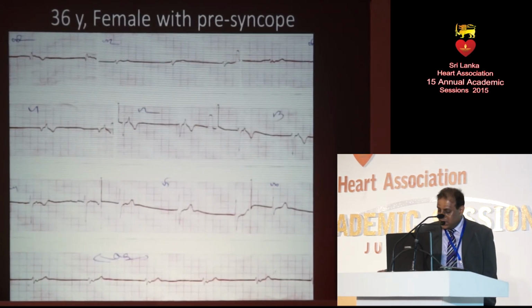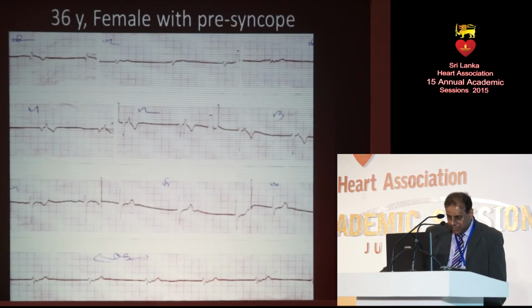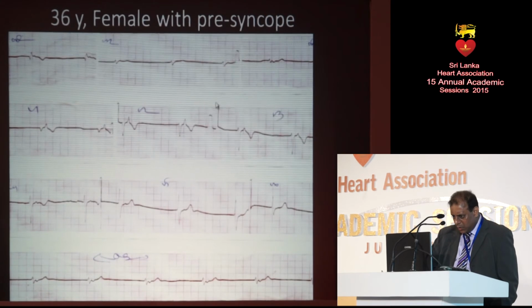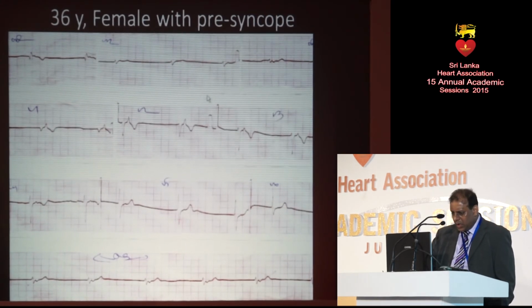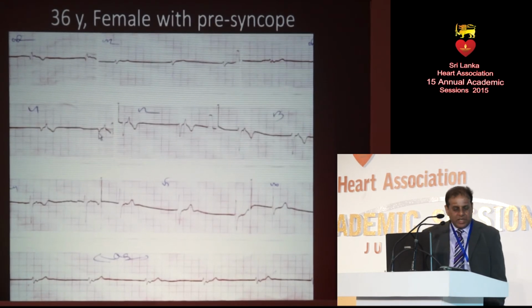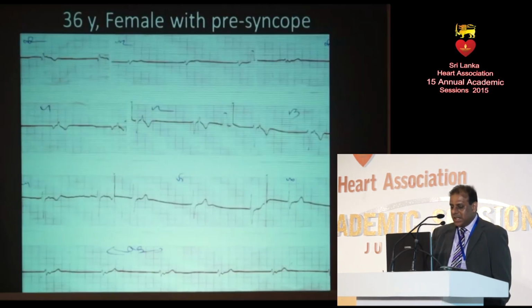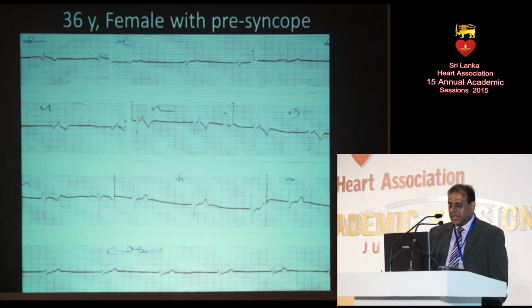You can see the QRS complexes, and you can also see an inverted P wave slightly before the QRS. That is a retrogradely conducted P wave, and it can happen in very slow junctional escapes, where the retrograde conduction to the atrium is faster than the antegrade conduction from the junction to the ventricle.